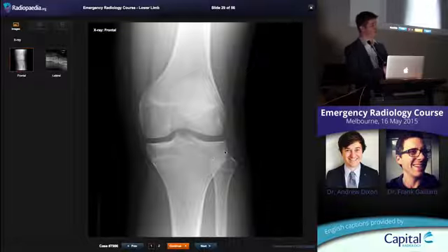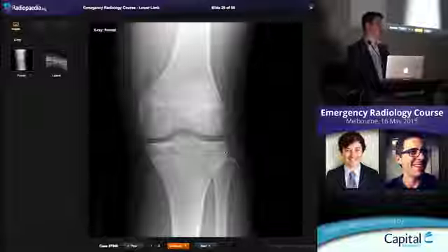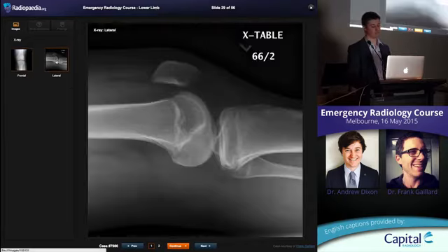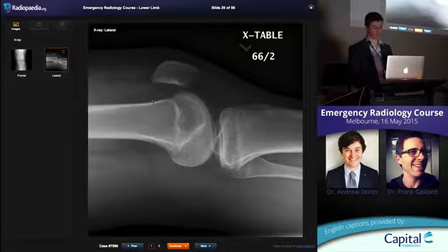It's another sign that they've had a twisting injury and they'll have an ACL tear or most certainly meniscal injuries. Okay, so they need to have an MRI. That's called an arcuate sign, if you see that. This patient does have a lipohemarthrosis, nice straight line sitting up here.